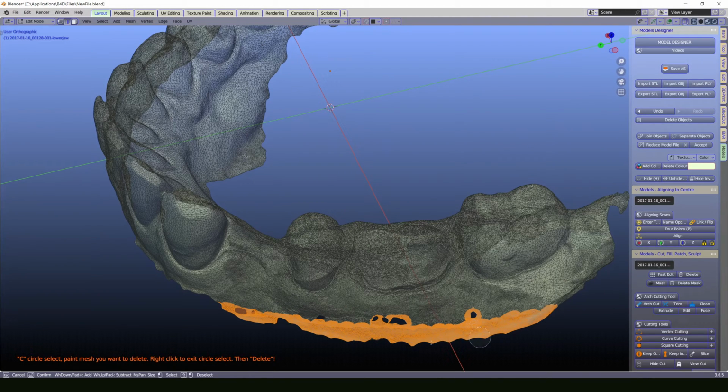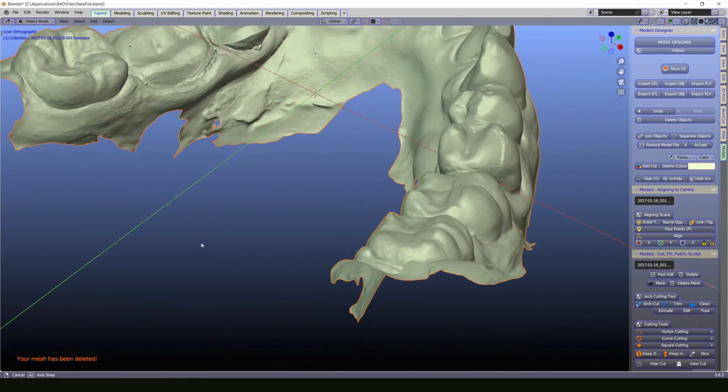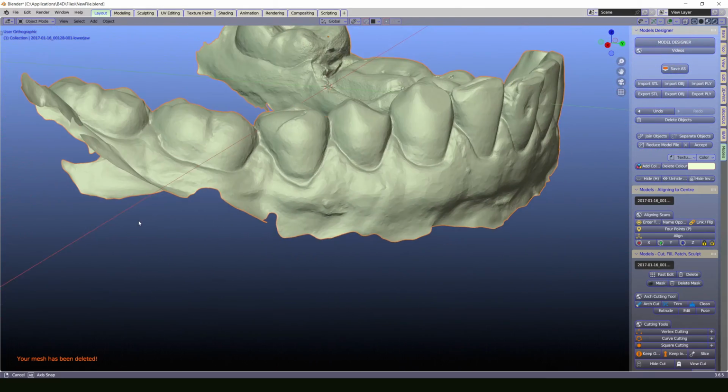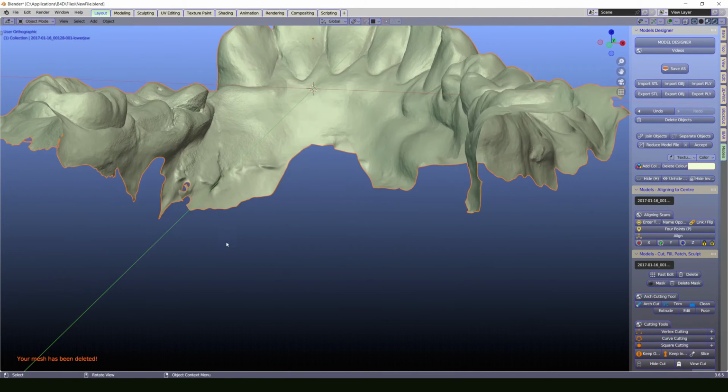I reviewed my files one more time, and I see that the model will be too high, so I am trimming more of the material which I don't need. Cut away all unnecessary material so you would have a fast print. Or of course, if you need those surfaces, keep them, but you will have a very high model.